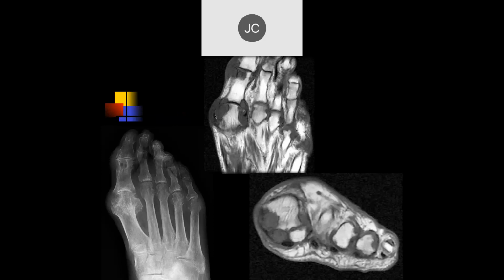Here's what it looks like on an MR examination. Very characteristic of gout. We'll talk about gout. We'll have a lecture about the pathophysiology, and I'll show the crystals and how they create inflammatory disease in a future lecture. And here, these typical sharp spicules on the edges of the erosions are really diagnostic of gout. With rheumatoid arthritis, the edges are always rounded off, and with gout, you get these sharp spicules of bone, which are pretty much diagnostic of gout.